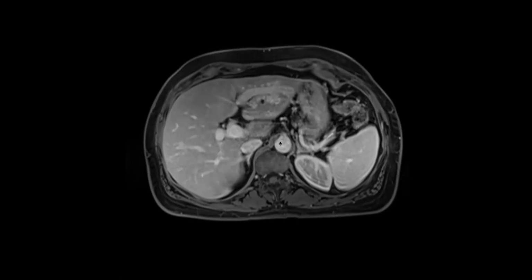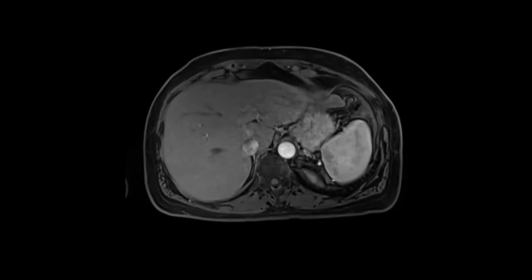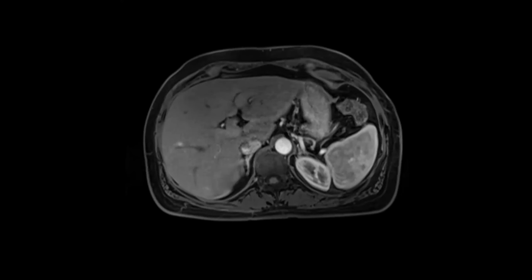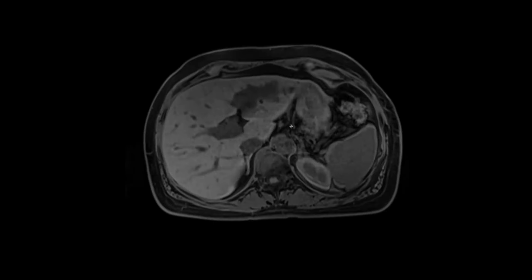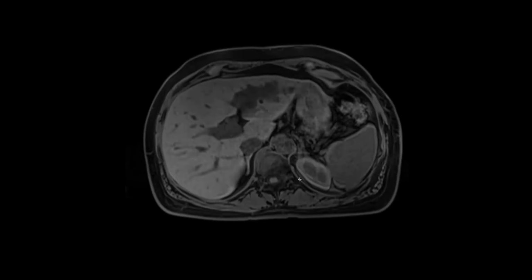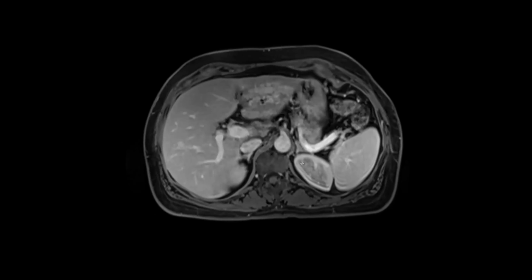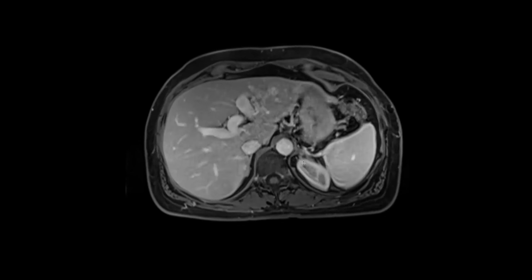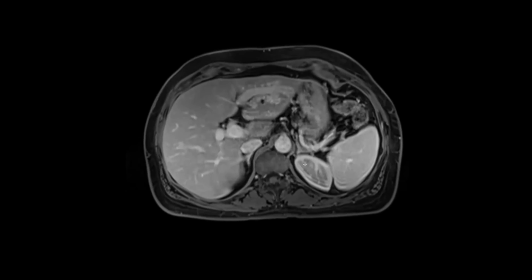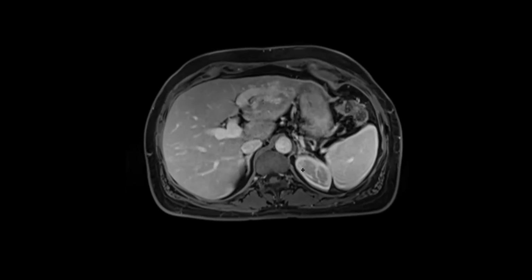If you go back to the first arterial phase, that region is not conspicuous, and similarly on the pre-contrast, obviously there is, but as Aarti mentioned, the 60-second shows it to have very similar signal to the vessels around it, and we feel that this may represent a vascular malformation. So good for this lady that she doesn't have metastasis in her left lobe.